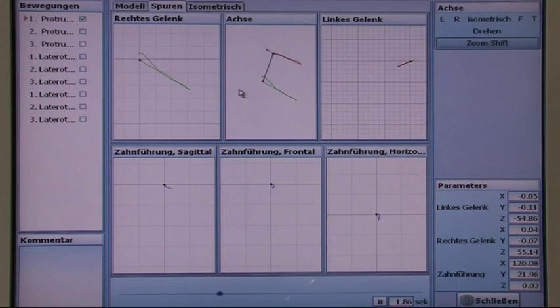For the middle window, which displays both condyles simultaneously, I go again into the horizontal display. However, here I have to adjust the enlargement in order to see both condyles. In addition, I can have further movement patterns overlapping. In this case, the active dynamic displayed movement is displayed as a coloured curve, while the other active movements are overlapped in grey.